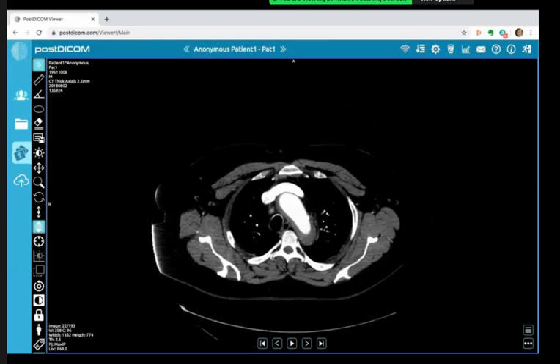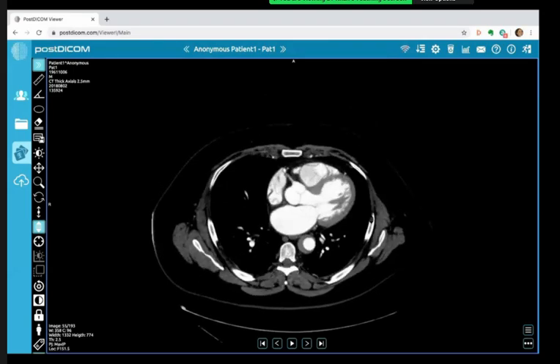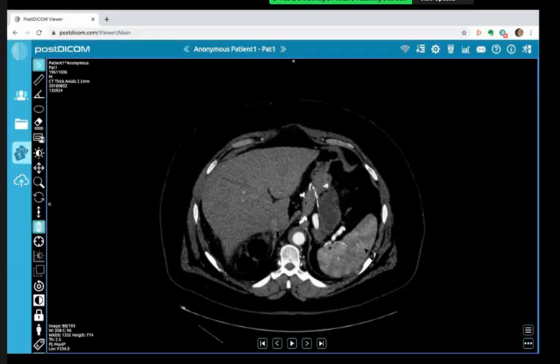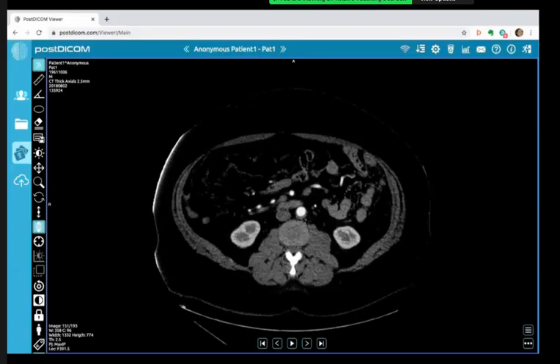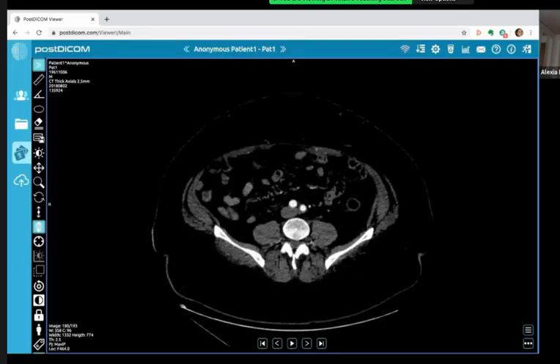So I would refer urgently. I will. Obviously, I will look at the extent of this intramural hematoma, whether, again, it's following the Stanford A or B distribution. But I will alert the on-call vascular surgeons. Right. Well done.